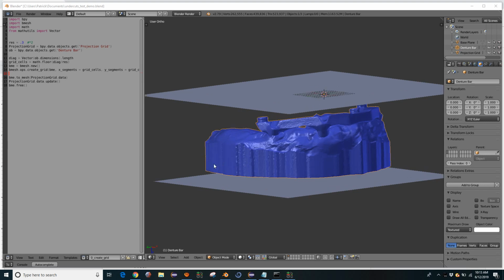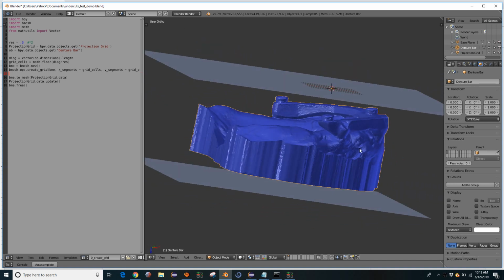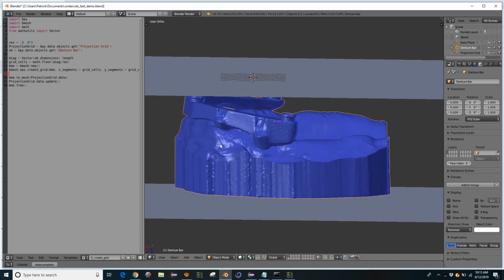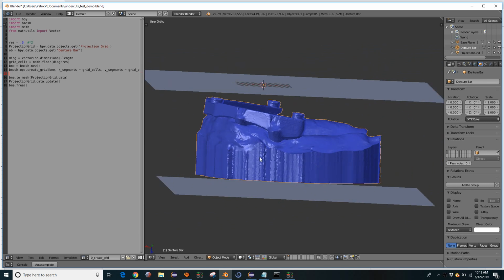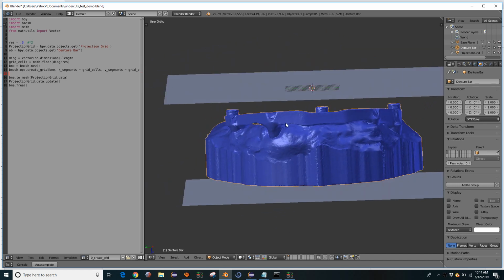This is part one of a video series about removing undercuts from dental triangle mesh scan data. It's applicable to other types of triangle mesh data. The concepts are the same, but this little series will be targeted at developers and modelers who are in the 3D dental development arena.